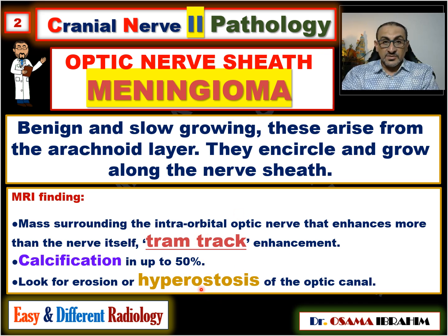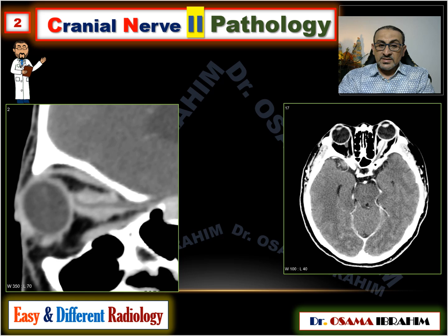So this, if it is present also, is a feature which proves the diagnosis of optic nerve sheath meningioma. And this is an example of optic nerve sheath meningioma in the CT.